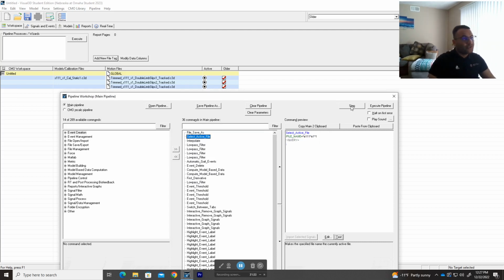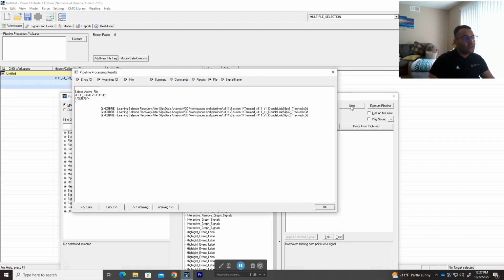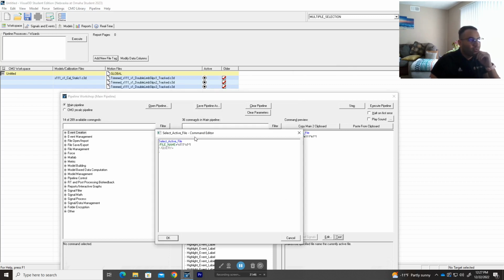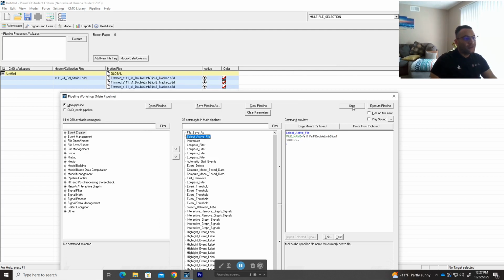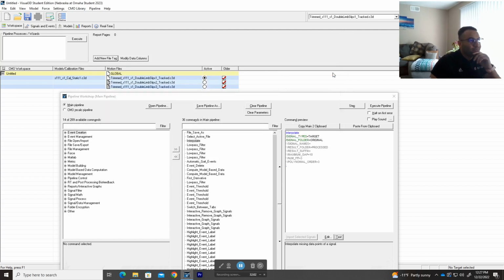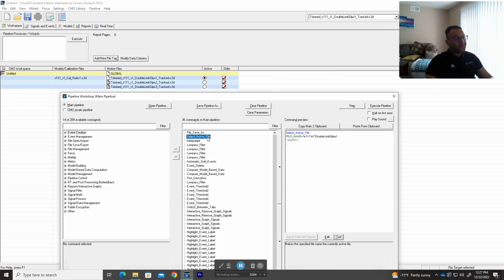If you just give it numbers, it should technically do that. So okay, it actually chose all of them because I also need to write the name. So it looks like I probably have to write here double limb slips and then 1. So let's step it and boom, it actually used that. Cool. So that's what you need to do.